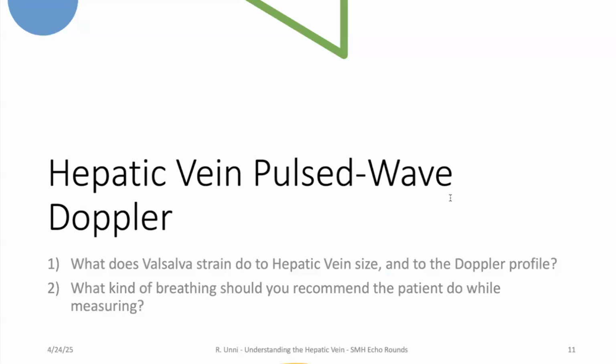And again, some questions I'm going to posit to the audience here: you've seen the hepatic vein. You might get a sense of what breathing does to the hepatic vein. What do you think Valsalva, when you strain, what do you think happens to the hepatic vein? I'll posit that as we start.